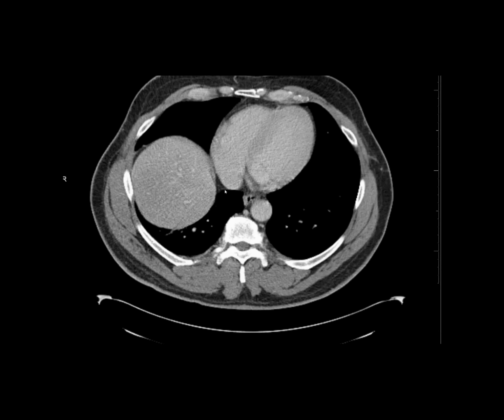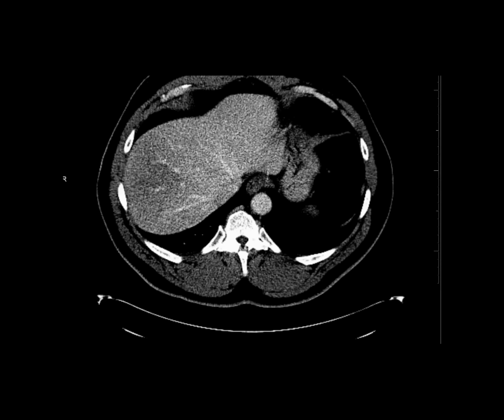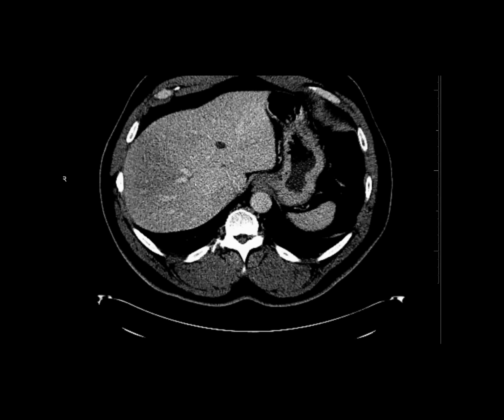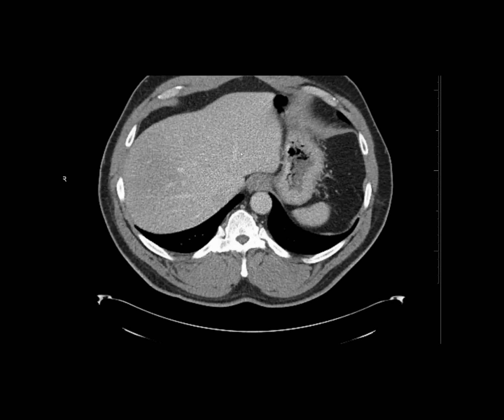And now going into the liver, as I do my liver windows, you see it's kind of heterogeneous. That is a lot darker than this. So I think that is just simply hepatic steatosis. Looking through the right portal vein, segments 4 and 2, we see this guy.